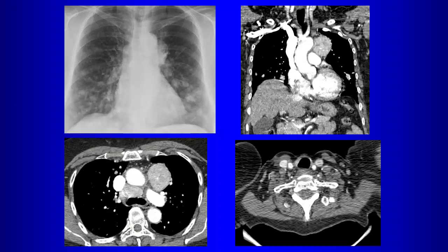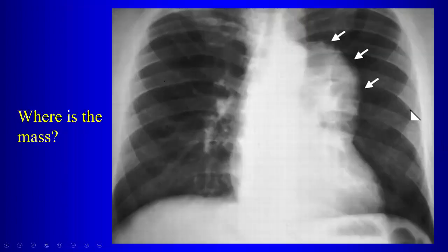Now, in this particular case, there's another finding that should help provide the diagnosis. What's the other finding? Looks like the thyroid's gone. The thyroid is missing, so how do you put the story together? Metastatic thyroid. Yeah, this patient had a thyroidectomy for thyroid cancer, and this is metastatic thyroid cancer, okay, with bulging in the AP window.